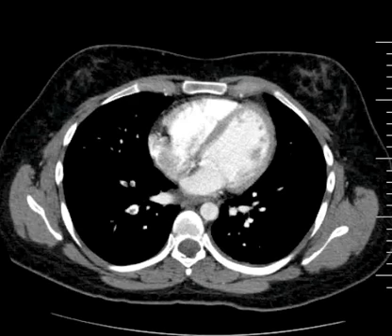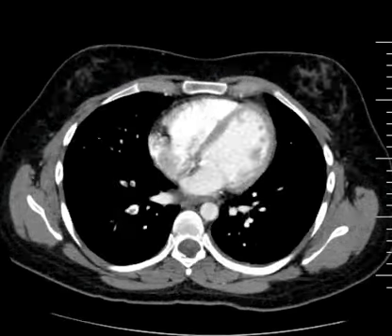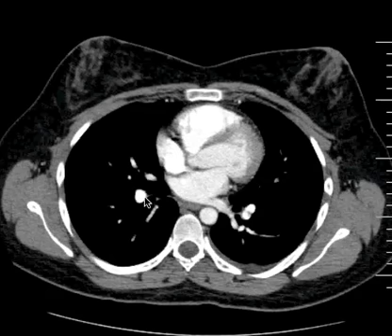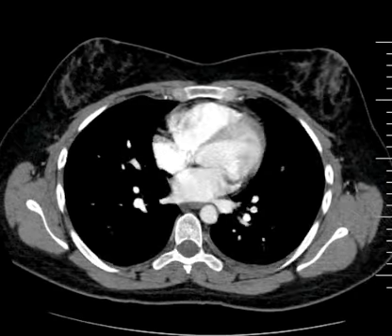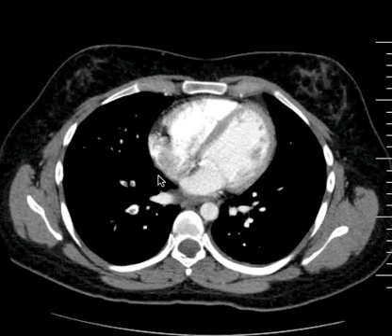Keep looking. Okay. I think that caught your eye too, right? Over on the right. Here we go. I'm going to go up out of them. And now I'm going to go back down. If you look at this vessel here, okay, following that, it branched, no PE there. Here, let's see, still none. Oh, maybe something there. There we go. Okay, here, there's one right in this branch point.